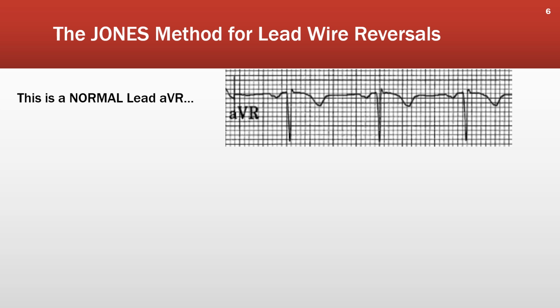And of course, the T wave should be inverted. But like all other normal T waves, it will be asymmetrical, as is this one: a gradual downslope to the nadir of the T wave, then a more rapid, brusque return to the baseline.